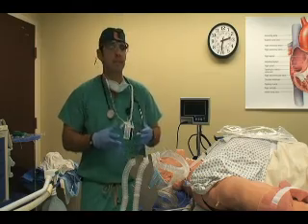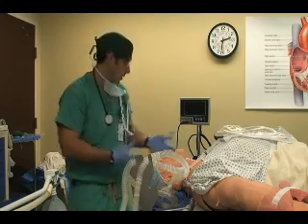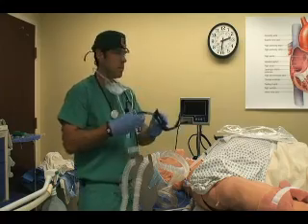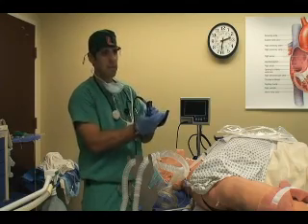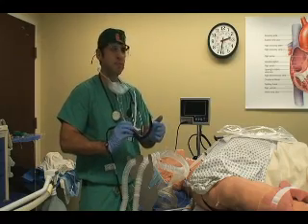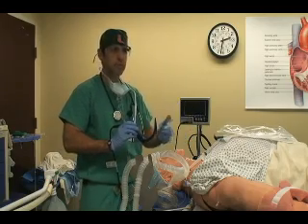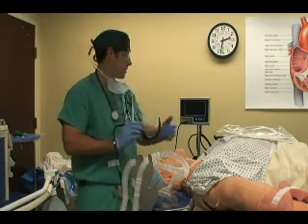The Glidescope is an electronically projected image on a lightweight monitor on what looks like a Mac blade. This is the Glidescope. Now, as you can see, yes, it looks like a Mac blade, but it has an acute angle on the blade. And this is what makes it a little bit different than a Mac blade. What this allows us to do is visually see an anterior larynx. So that's why we would use the Glidescope for difficult intubations or anterior larynx and give us better visualization.